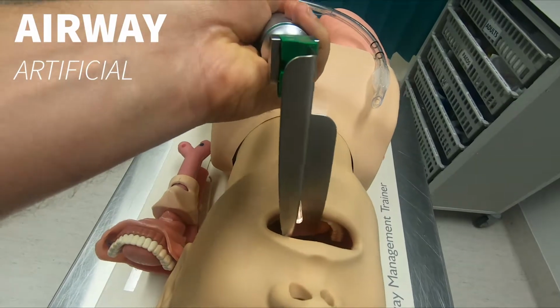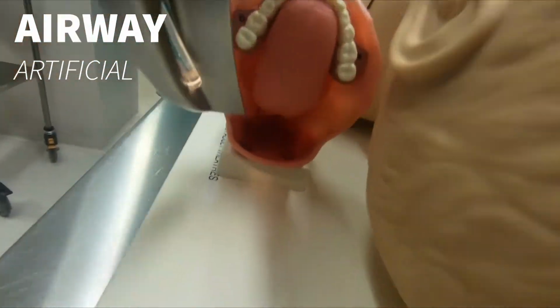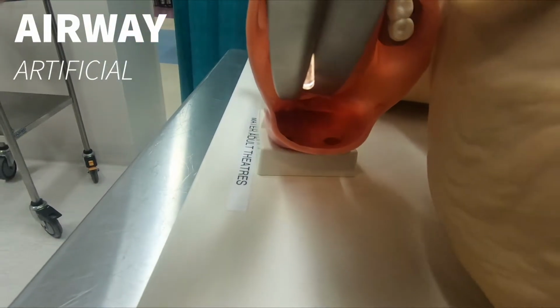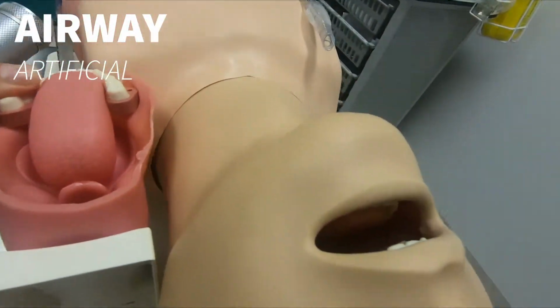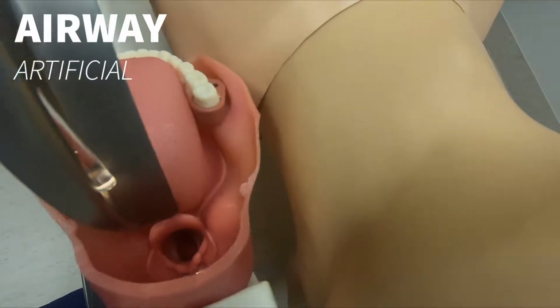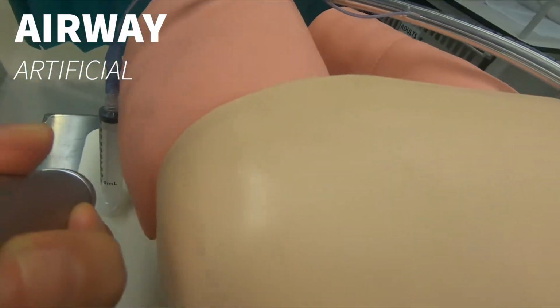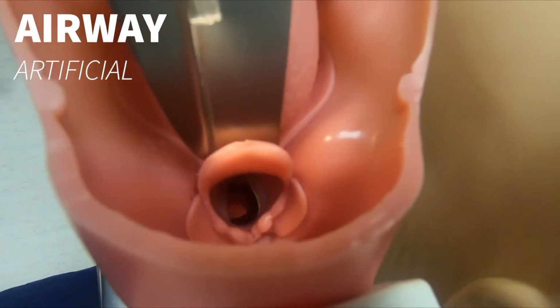Right, and this goes then, depresses the tongue, but we'll do that on the model here. It depresses the tongue, and it should sit between the tongue and the epiglottis. So let me see if you can get a better view. Yeah, the tongue and the epiglottis. So this one will go over and then sit over the tongue and in the epiglottis.